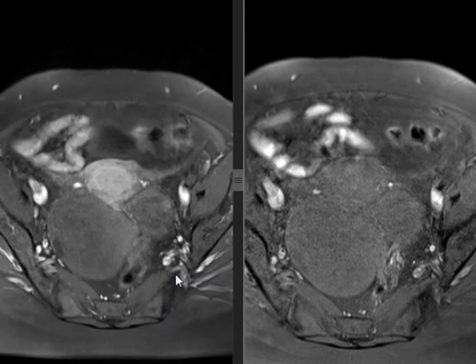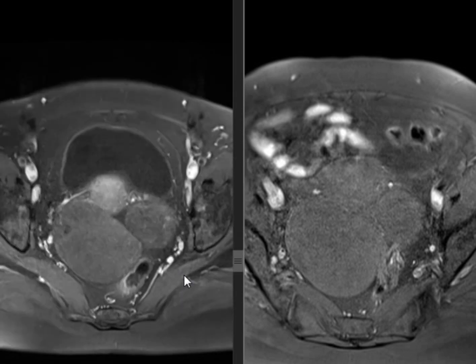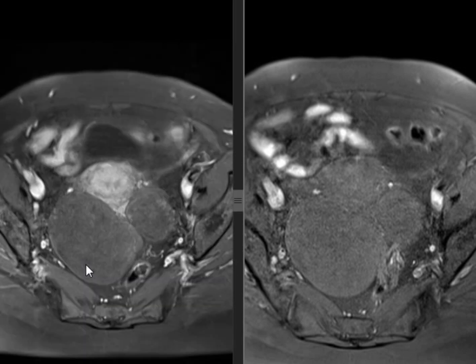So the gynecologist, as she's 60 something, did a hysterectomy with bilateral oophorectomy. What's your differential diagnosis? Ovarian fibroma. Bilateral ovarian mass. Metastasis is a possibility, but we would think of enhancement more, free fluid more, pelvic lymph nodes more, possible signs of extension to adjacent structures.